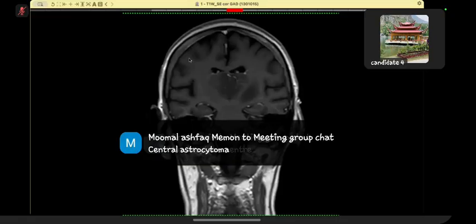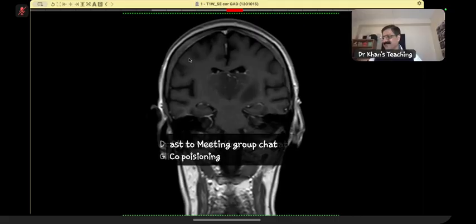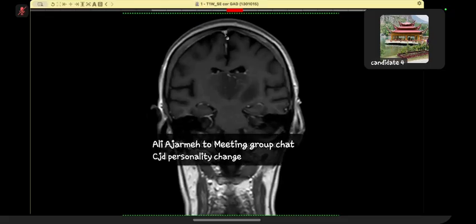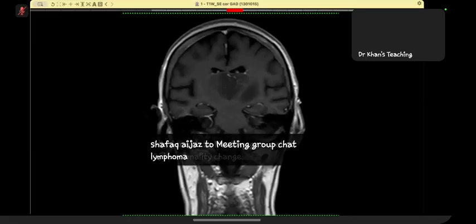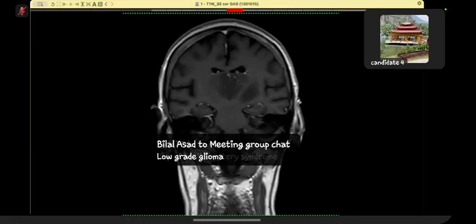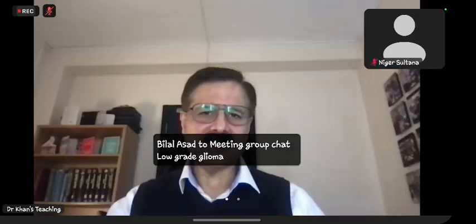Sir, it's carbon monoxide poisoning, neurocytoma, central CJD, CADASIL, glioma, Japanese encephalitis. Who said glioma? That is the correct answer. Glioma, sir. Dr. Fahad Abdi. So a few hands for whoever said that. Okay, well done. Gliomatosis. Yeah, this was gliomatosis.